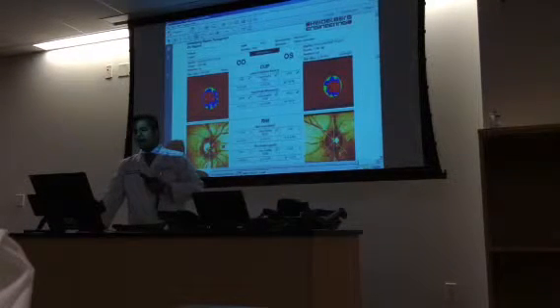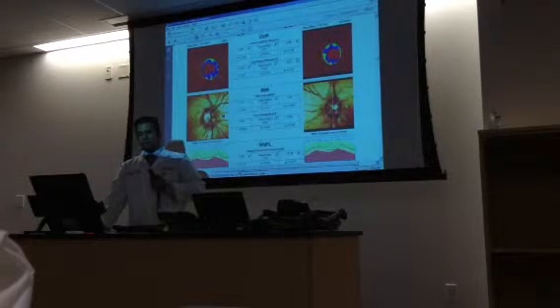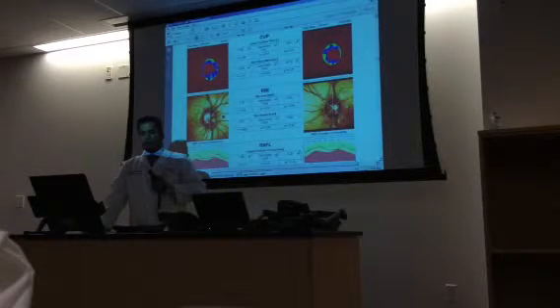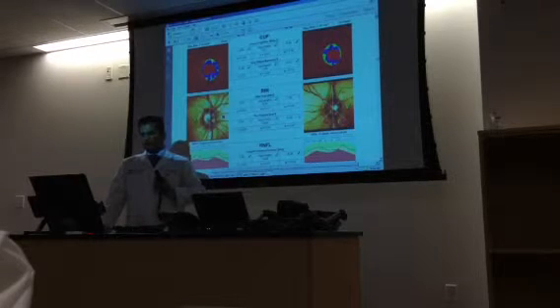That has average, African American male that has average disc size, left eye, large disc size, right eye. Moorfield's regression analysis is outside normal limits, but before you go to that, you have to say right eye, temporal, right eye, its nasal sector is outside normal limits.